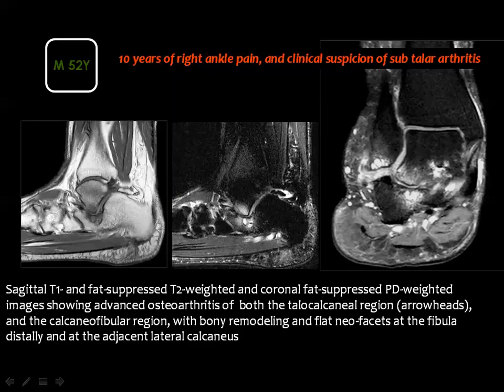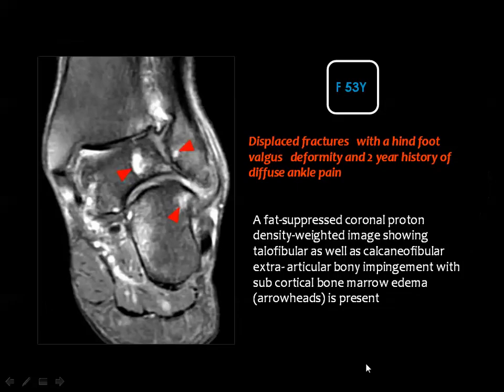And the osteoarthritic changes of the talocalcanean joint are evident here in the T1 and the STIR with subarticular pseudocystic changes and degenerative bone marrow edema. In the coronal image, you can appreciate that the talus has displaced medially, and now the fibula is facing the calcaneus with severe degenerative changes, subarticular pseudocystic changes in the joint interfering between both.